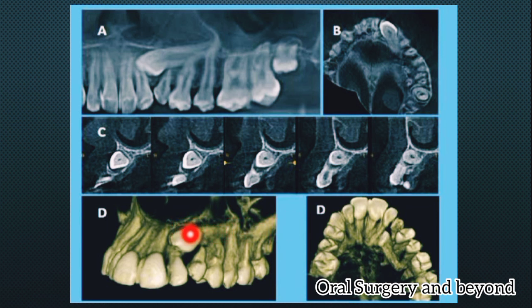Here we can see there is less bone cover. So whenever we take the flap here and expose the gums, we do the corticotomy here. We remove the buccal cortical plate here, where it may be only an eggshell-like bone. Then we section the crown here. We take out the crown and then we take out the roots. We can see that the root is more toward the palatal side of the premolars.